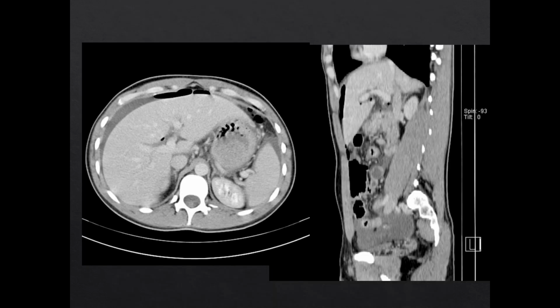Now, as I've said with the previous diagnoses, CT makes it much easier to spot free air, and pneumoperitoneum is no exception to that. In this axial CT, you can see plainly these black areas here, these radiolucent areas where air has escaped, likely from a perforated bowel, and has accumulated anterior to the liver. And on this sagittal cut, you can see it here too. Remember that this patient, even though it looks like he's standing up, is actually laying down, so the air is going to move anteriorly in the body, and you can see that on both of these here.